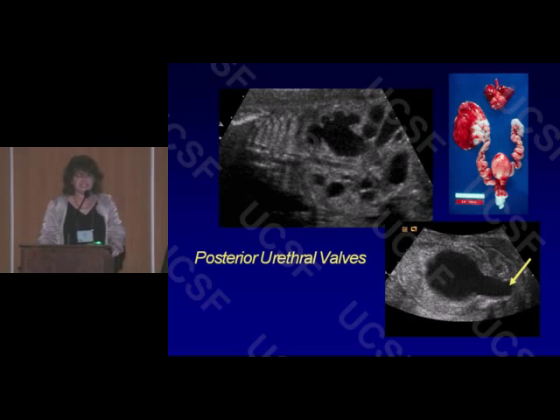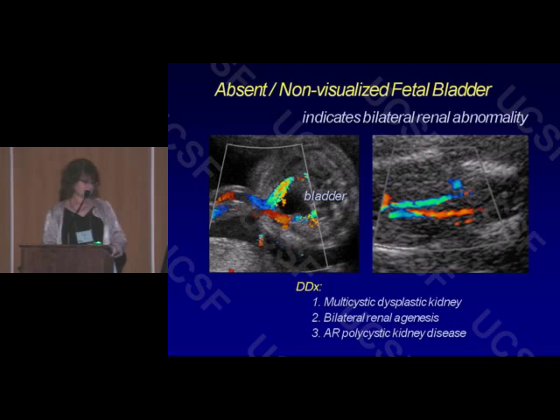In addition to the dilated bladder with the characteristic dilated posterior urethra, we often see associated hydroureteronephrosis as shown here. This constellation of findings with oligohydramnios can result in lethal pulmonary hypoplasia.